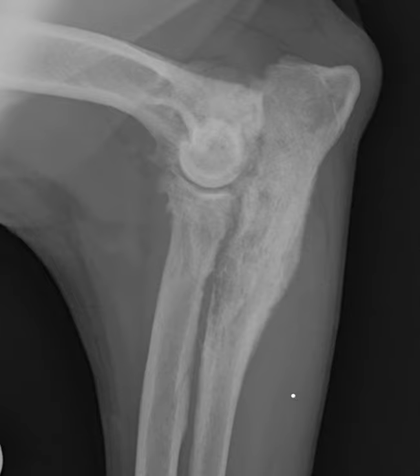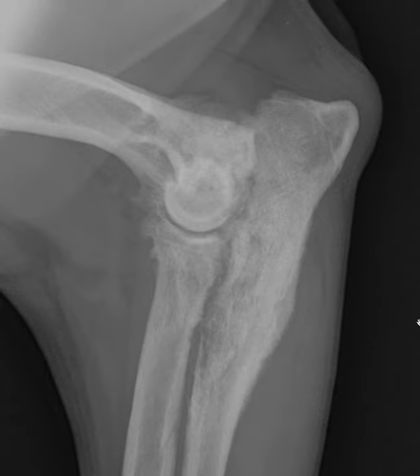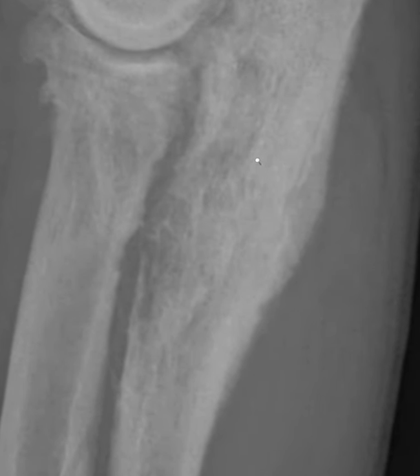Bone lysis is one of our most concerning things when we're looking to categorize a lesion as aggressive. You'll recall that the rest of my list for an aggressive bone lesion is bone lysis, periosteal reaction, or type thereof, zone of transition, and rate of change. Last week we saw a smooth periosteal reaction. You may have noticed when you were tracing the caudal cortex that it extends out a little bit and almost looks smooth. I would encourage you to always zoom in on a periosteal reaction.